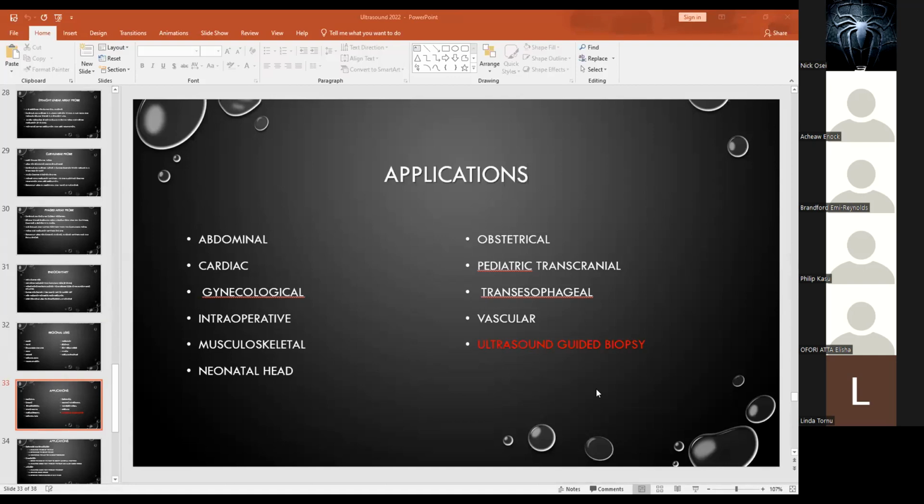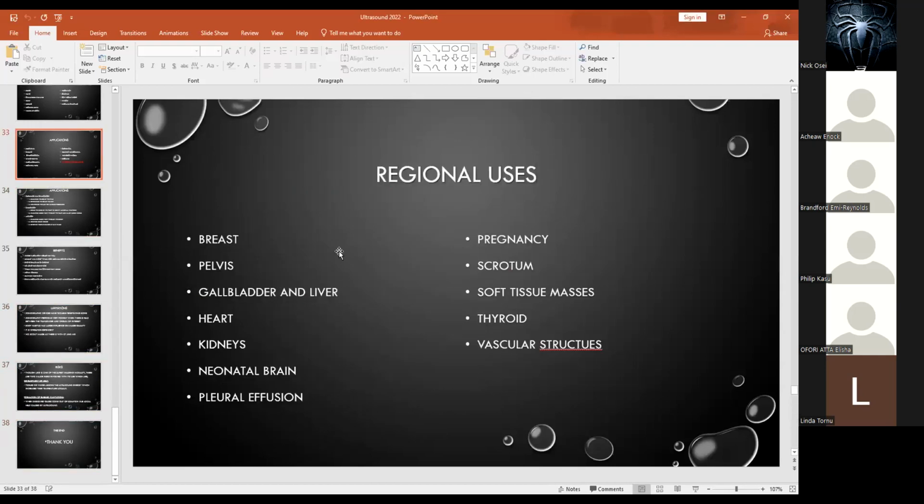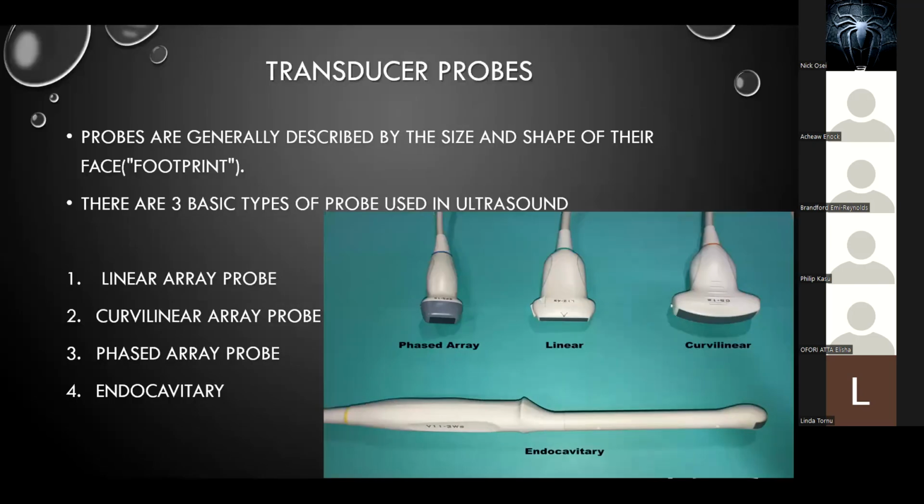Can you see the picture of the probe now? Yes, Doc. So this is the one that is used for transvaginal scan, for instance.